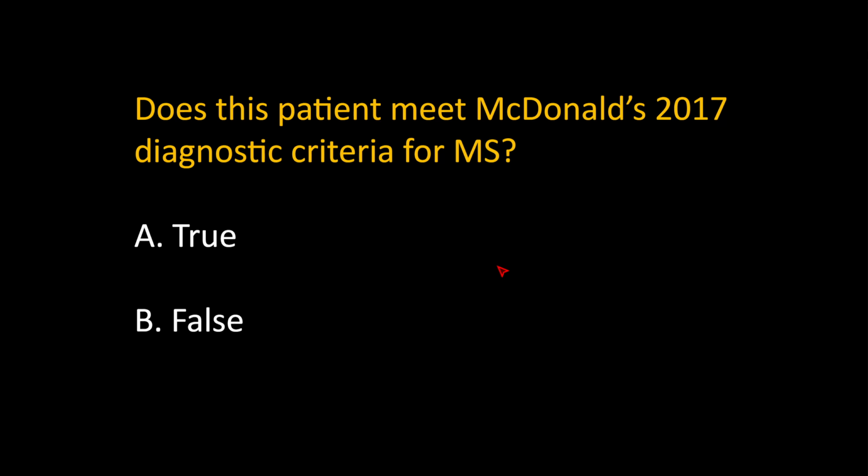And that's why it's important for these cases. So you have focal unilateral spinal cord lesions to proceed to and recommend brain MRI, because the brain MRI would allow you to basically diagnose MS. Doesn't matter what the lumbar puncture shows. If you get a lumbar puncture, no matter what it shows, you can't diagnose this patient with MS.